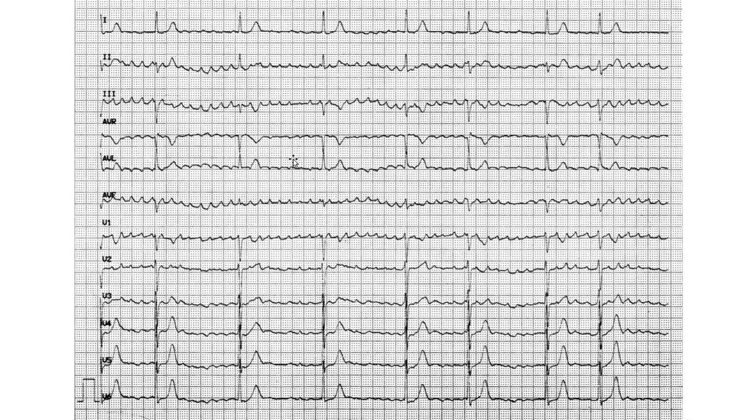So over here, if we go deep in and we see between this peak, I'm just going to give you a spoiler, this is flutter. Basically we check the distance between two peaks. Between this peak and that peak is 1, 2, 3, 4, 5, 6, I'd say about 6. Let me get my calculator.